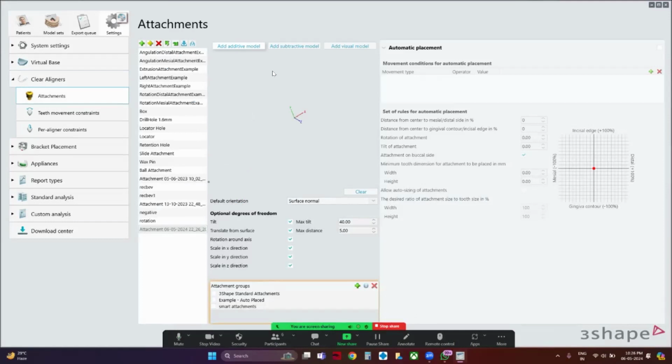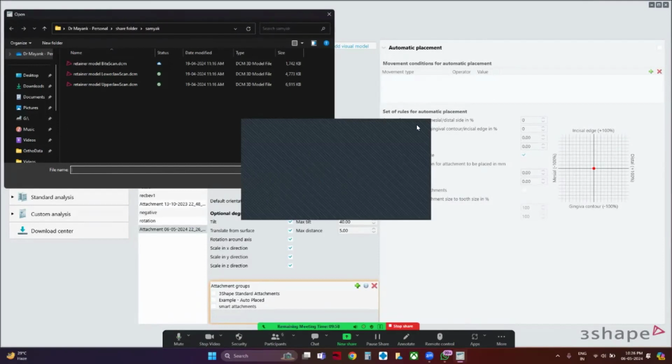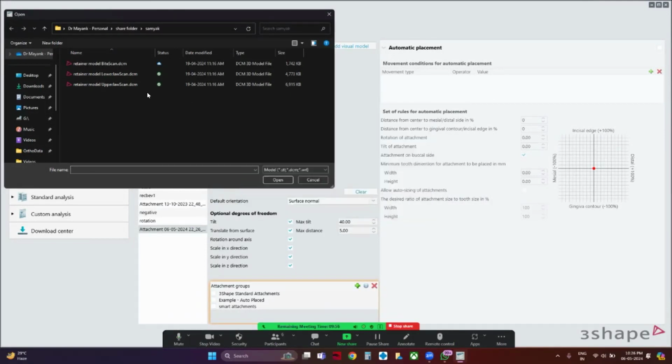Okay. Import karna kahan hai? Haan woh. So then now you browse to wherever you have located that, whether it's downloads or something. You select, double click. Only 10 minutes are remaining for the meeting. Okay.